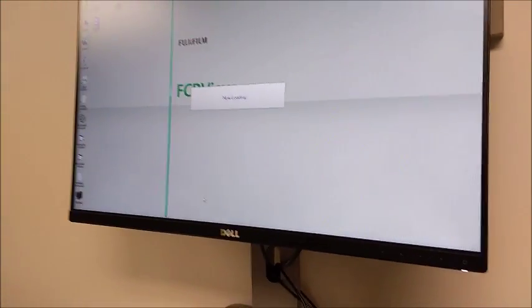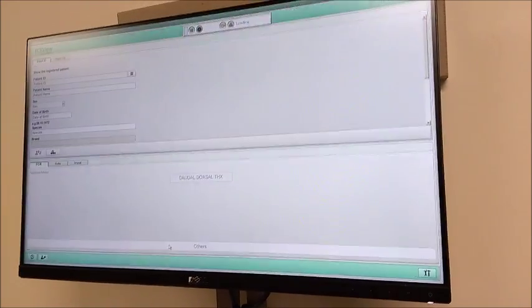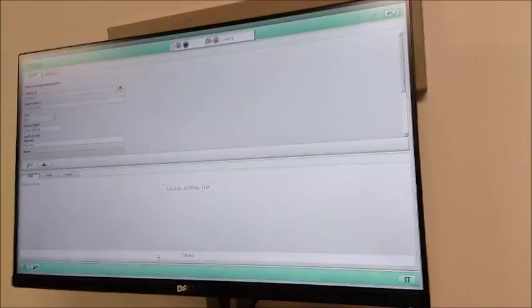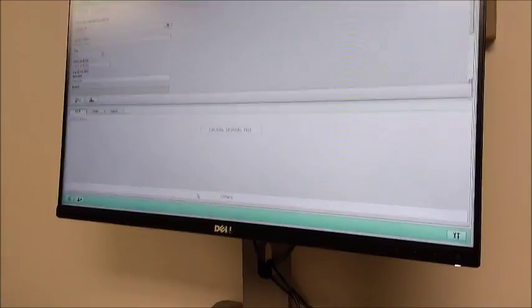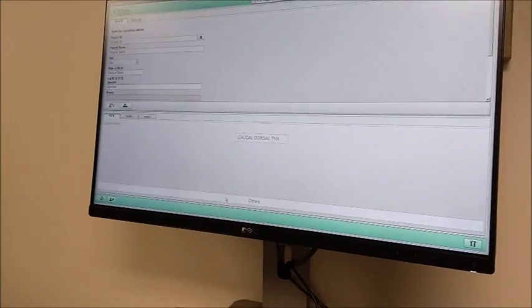When you exited the first time, you said if you just want to exit the application. That's what I did. Was there a way you could have just exited and shut down the whole thing at once? Yeah, there's a shutdown option too. That's what you'll be using. I think that's what came up automatically, by default.